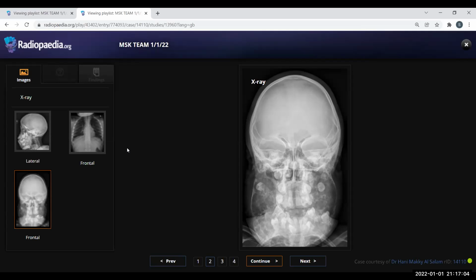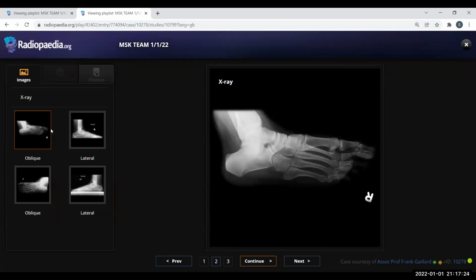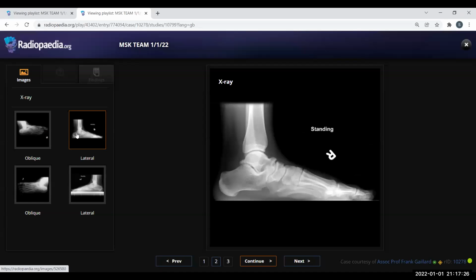This can be followed by a question on McCune-Albright syndrome. Every case, they usually follow it with a viva question, a pertinent one, which I'm sure you know: the precocious puberty, which is associated with it, right? So well done. Here in the calcaneonavicular coalition, you did very well to use the terminology of talar beak. This talar beak is also seen in the talocalcaneal coalition, but also in calcaneonavicular because of the dynamics which change, right?